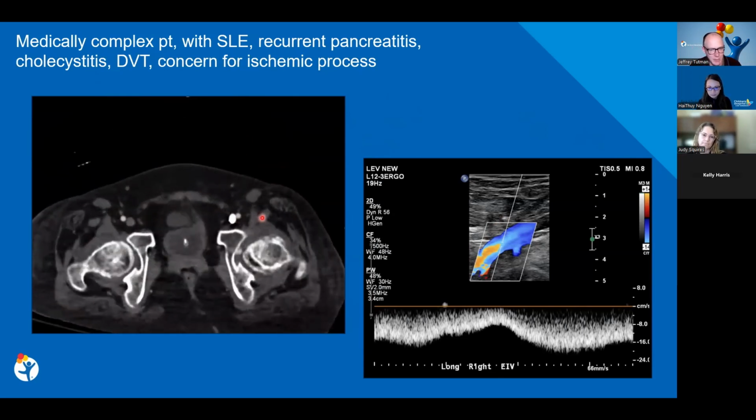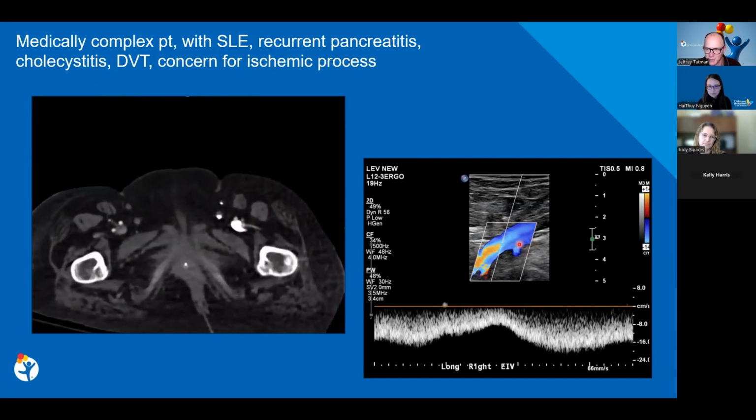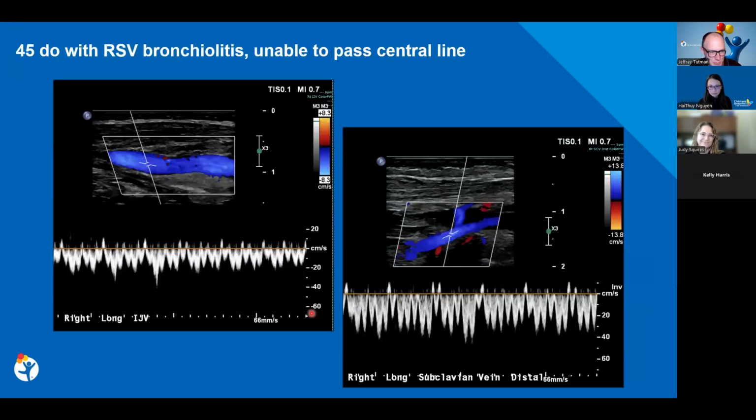After we did some more investigation, this patient had like 5 follow-up ultrasounds for follow-up of clot, and we never saw anything at all. These looked totally normal. So we looked into this, and this patient had a lower extremity catheter where they got their IV injection, and we historically didn't have a great process for being aware of what catheter got injected with contrast. It was really difficult to find that information in Epic. So we did end up changing that, but this was an interesting case. When you see stuff on CT, just remember that ultrasound is believable. You don't need to do it a bunch of times.